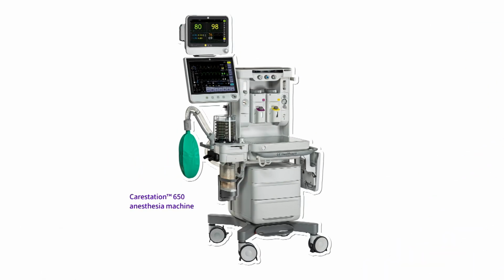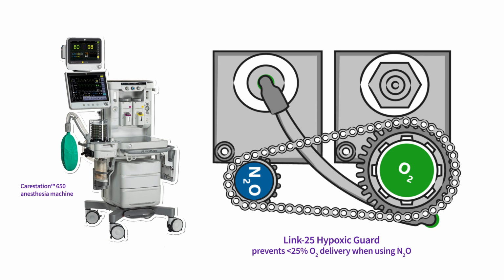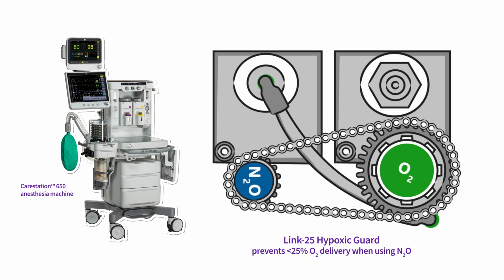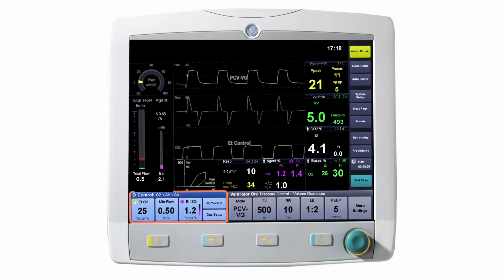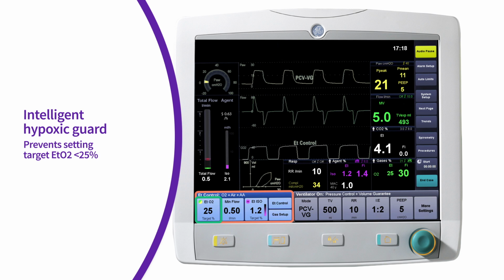With manually controlled circle anesthesia systems, there are conventional hypoxic guards that control the oxygen percentage in the fresh gas flow and not the circuit FiO2. This could result in hypoxic levels of inspired oxygen. GE HealthCare's ACES CS² end-tidal control contains an intelligent hypoxic guard, since the oxygen percentage is controlled at the patient level by automatically compensating for the metabolic rate changes, ensuring targeted end-tidal values.